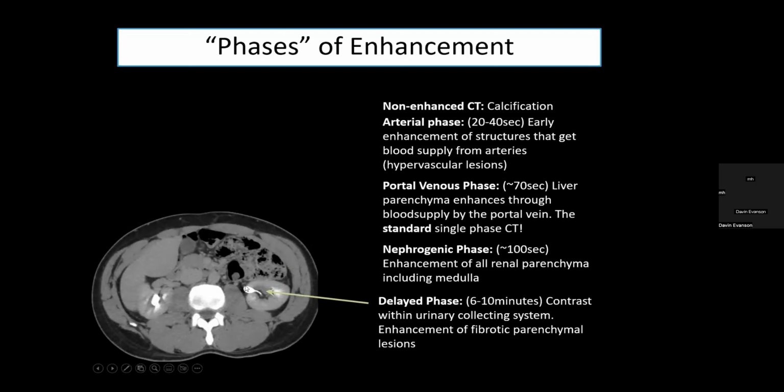And a lot of radiology is pattern recognition. So we're trying to see how these lesions are doing, if they're enhancing, if they're washing out, early, late. That's what a lot of radiology, especially abdominal imaging, is about, learning the patterns of enhancement for these lesions. I'm trying to decide if a lesion is benign, like a hemangioma, indeterminate, I can't tell, or definitely suspicious, like an HCC.